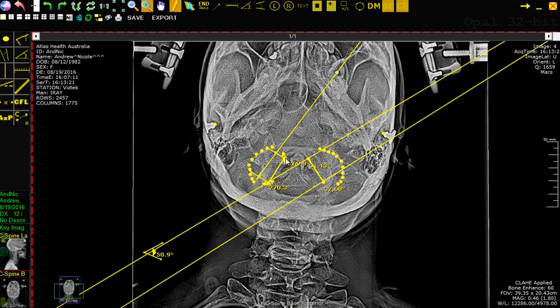So we would click on anterior 1, anterior 2, posterior 1, posterior 2, and you see it's not identical, but remember that very first line we did, I said it was actually a little bit off. Well, it turns out that I was probably going to be off by about 1 to 2 degrees. Sometimes that doesn't make any difference, and sometimes that makes all the difference, hence trying to be as precise as we possibly can.